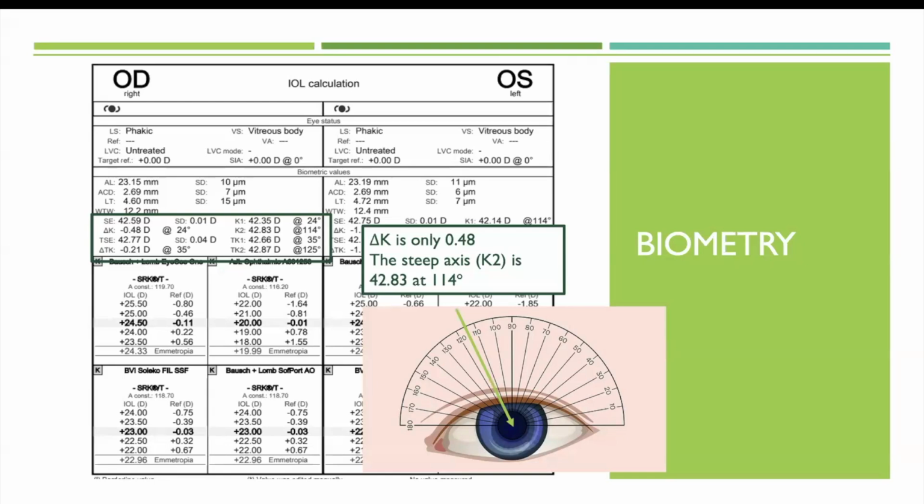So this is probably not necessarily worth thinking about, but it's just a quick comment in terms of if you are hearing your bosses or people talking about where you'll sit or where this axis is, this is how it's calculated. So the 180 starts to your left-hand side, down to 0 to the nose, and then it starts at 180 again at the nose and all the way around to 0 again on the left eye.